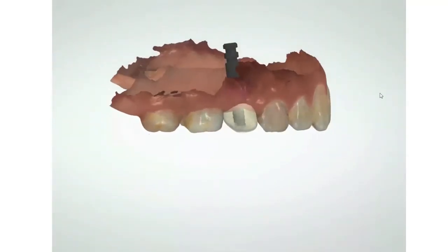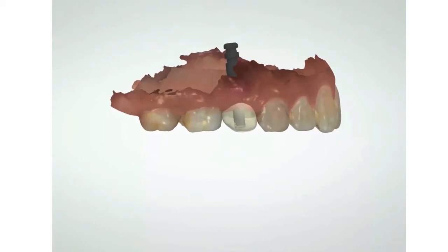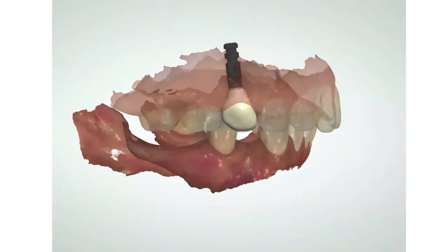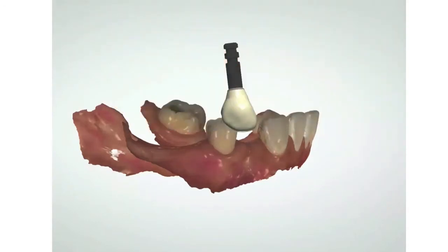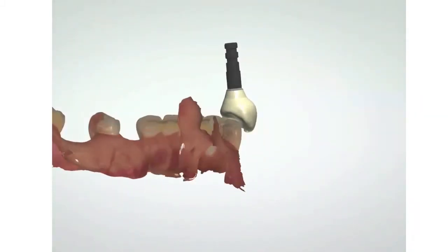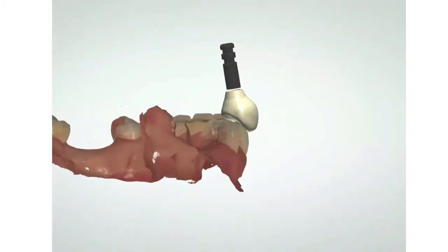And so the complete design for the provisional restoration, including the selection of the exact component, is done at this point. All I've done is see that patient for an initial consultation of 30 minutes, and all this is being done behind the scenes. When this is being designed, we can look at everything. We can look at not only the implant position that's been imported, because that's where the implant is going to go, but the design of the provisional to support the soft tissue, and to a certain extent fill out some of that soft tissue concavity.